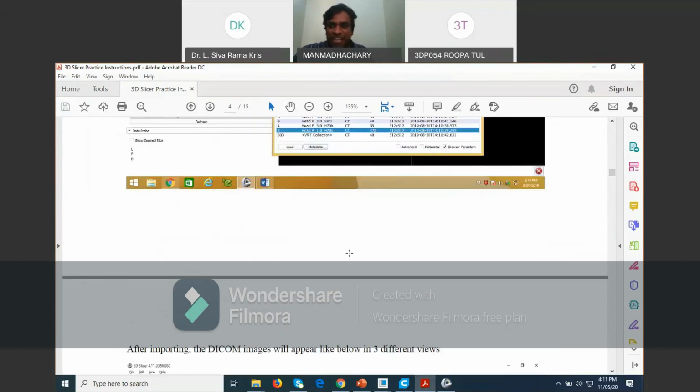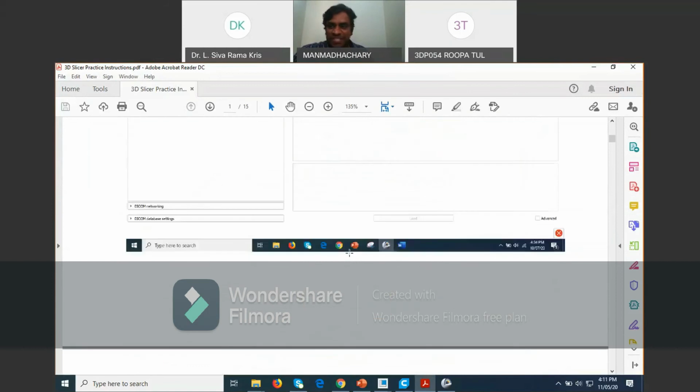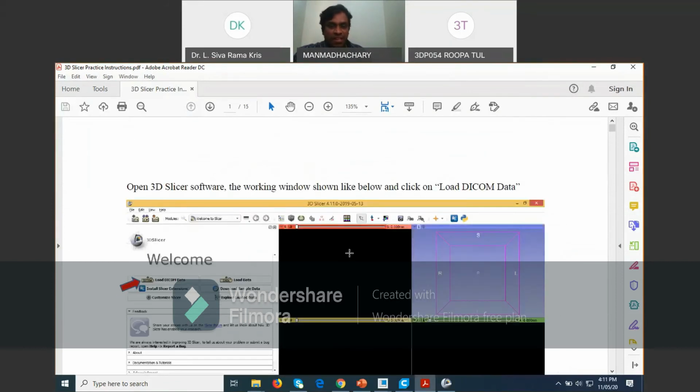Here in the PDF file, I will explain to you once again, just within 5 minutes. Suppose you are stuck on anything, you can check here.